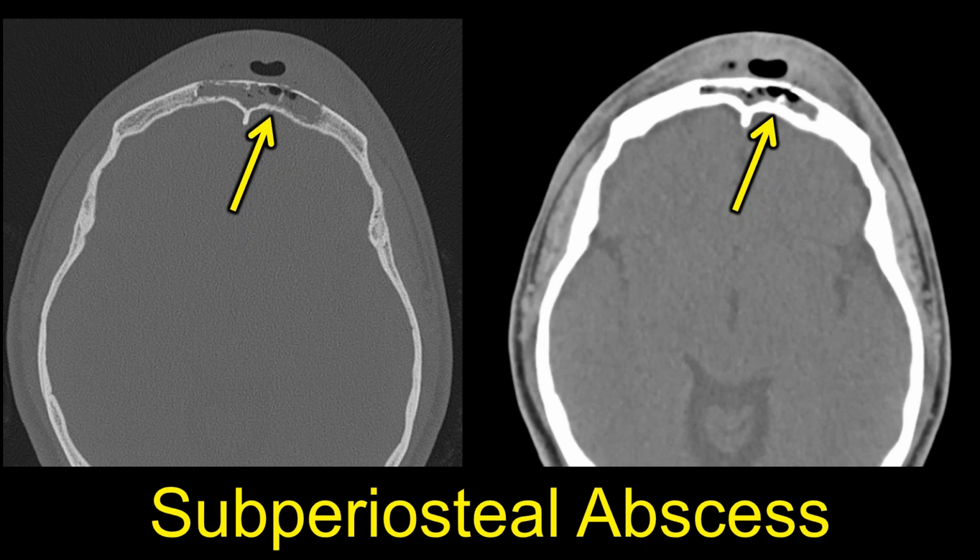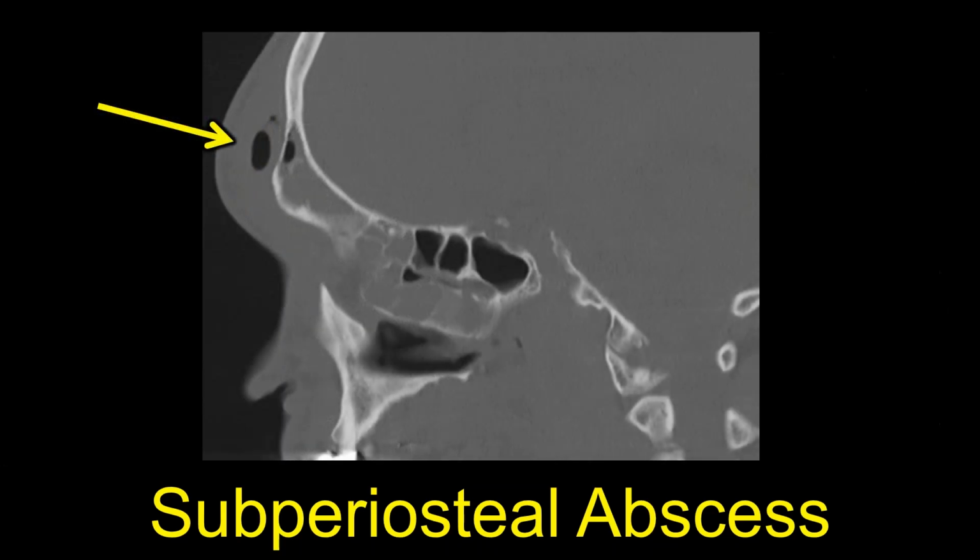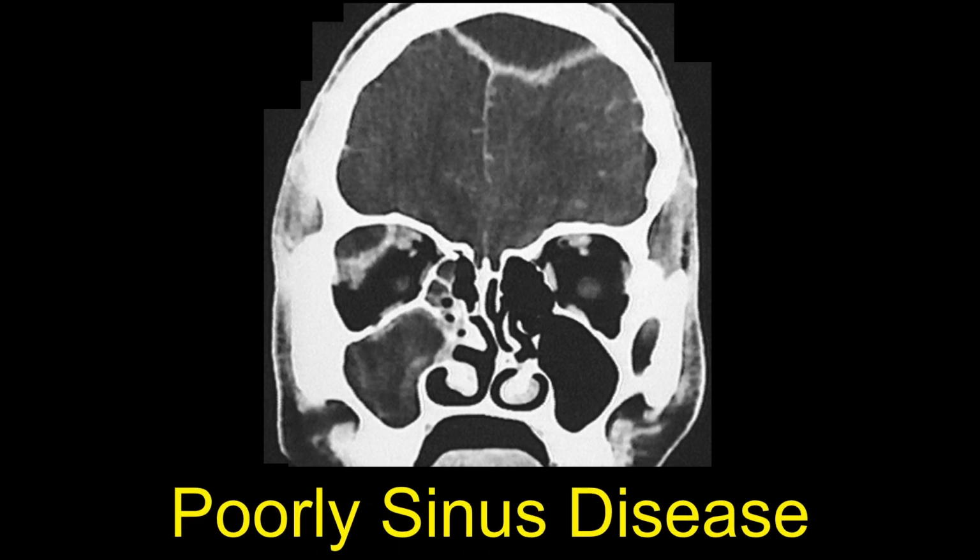So that sinus disease may decompress anteriorly into those frontal soft tissues, or it may go back posteriorly or down into the orbit. Here's another case, I think that same case, where we see air and all those inflammatory infectious changes of the forehead. So you can imagine this mass coming anteriorly on the forehead from the frontal sinus disease that's decompressing itself because it was not opened up.